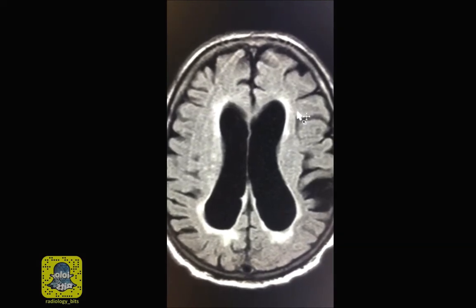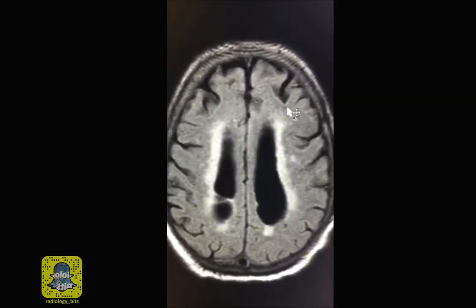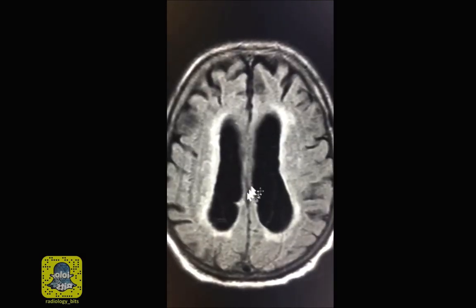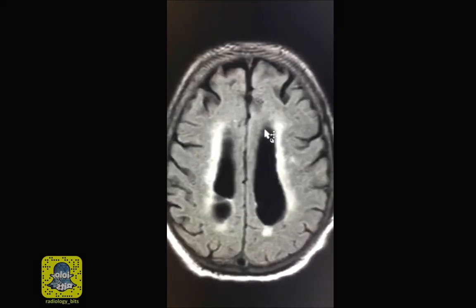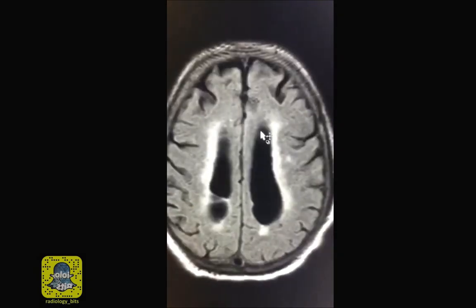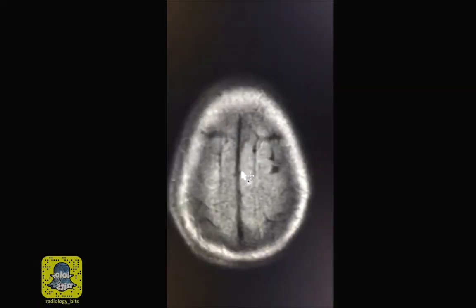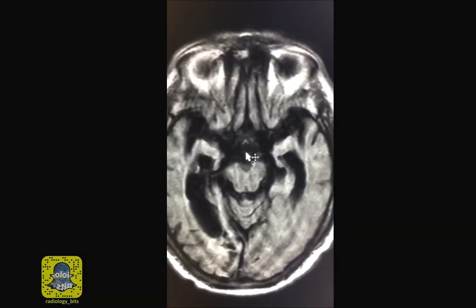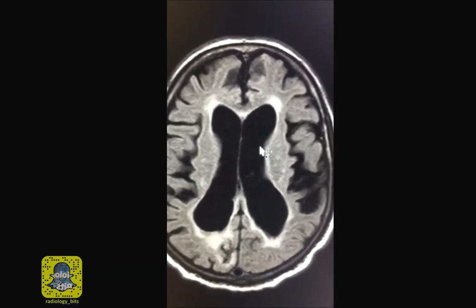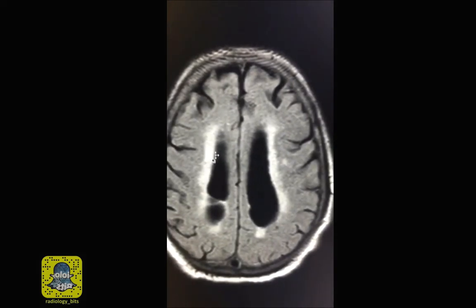On imaging, it's a bit tough to diagnose because elderly patients would have atrophy, and the hint is to find disproportionate dilatation. In addition to that, try to look for fullness at the convexity, pronounced appearance of the sylvian fissures and the basal cisterns, as well as features of CSF permeation.